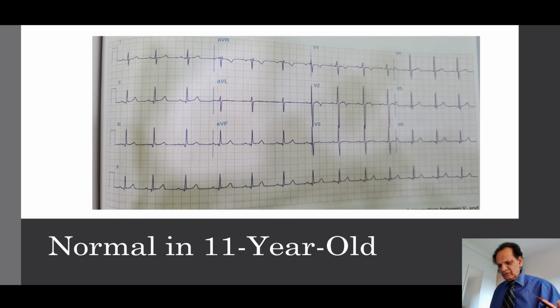This ECG you may really misinterpret as an ASD or something, because there are T-wave inversions in V1, V2. Never mind, in this age, this can be a juvenile pattern.